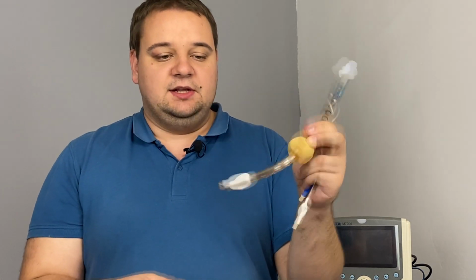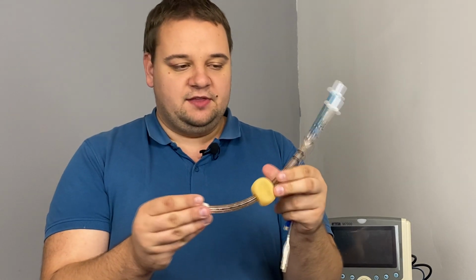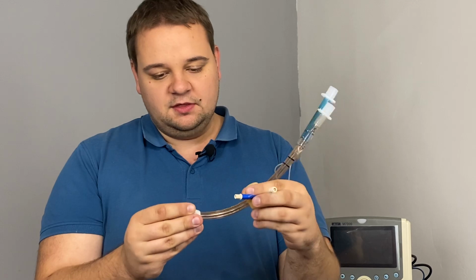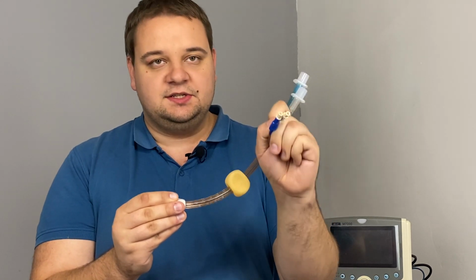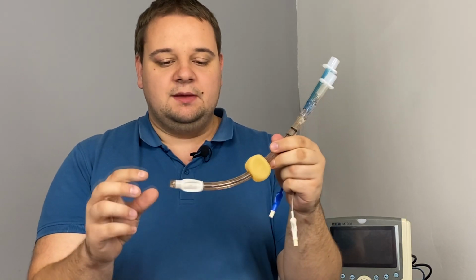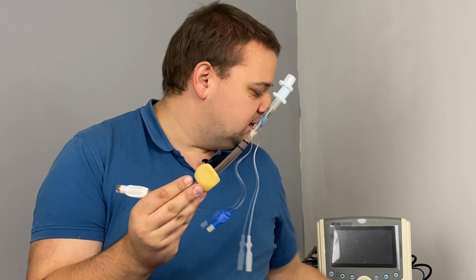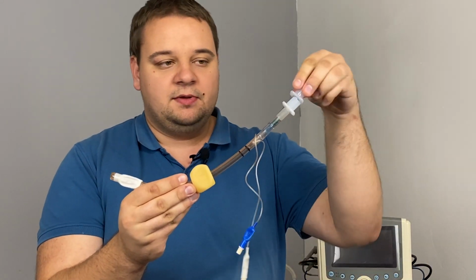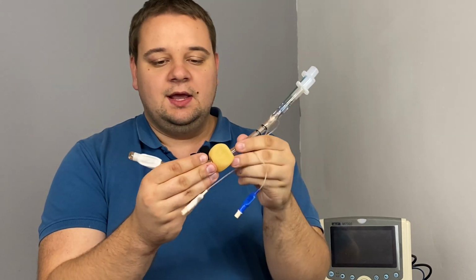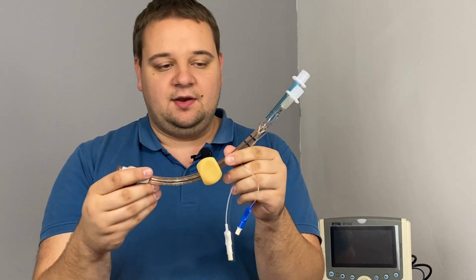So ideally, when we push it down, it comes to the esophagus, then we inflate 2 cuffs. There are 2 cuffs inflated separately in this case. But when they are on, we will get the same idea that we had in this tube. So the air will come here in line 1 and it will come out here on this exit point, and it will get inside the airway.